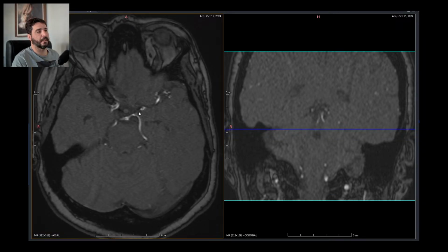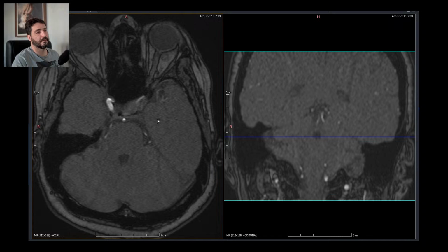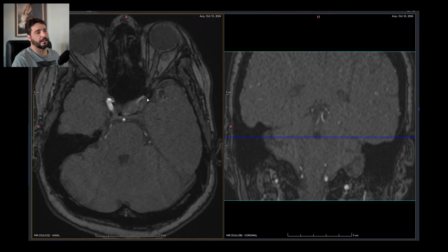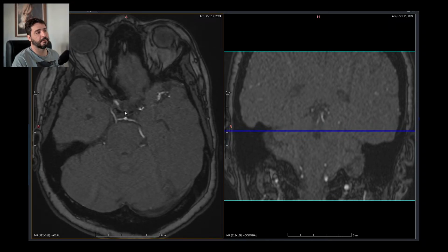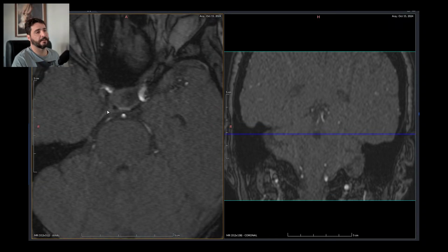This is mostly artifacts. I can't really say, it's on both sides. These are acquisition artifacts right there too. This is a very bad exam. I can't really say much. This is shaky, so there could be a stenosis here, but I can't tell because there is a band of artifacts going right here and yet another band of artifacts going from there to there.